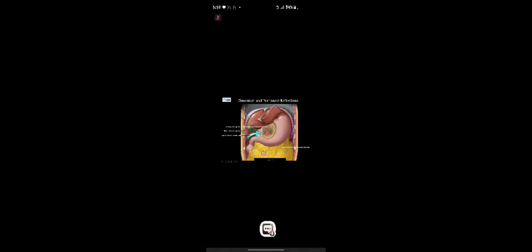It is an area of interest for anatomy because the epiploic foramen is there, and behind this is the lesser sac. Lesser sac is important for the exam, particularly in the radiology exam. We show a lot of cases and things like that. You should have a clear-cut idea that this is the stomach, this is the peritoneal cavity, and this is the greater omentum where I'm pointing out.